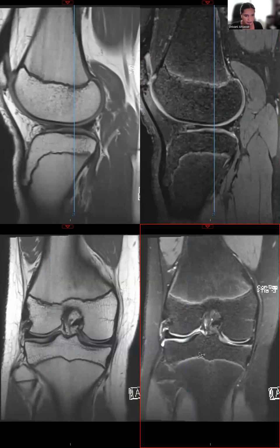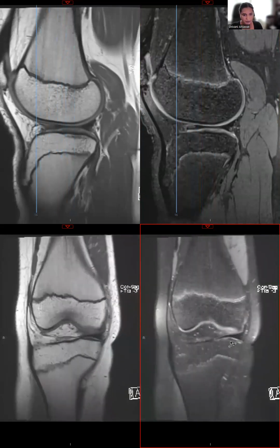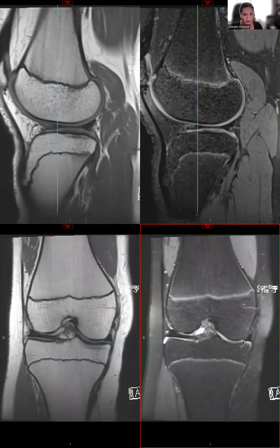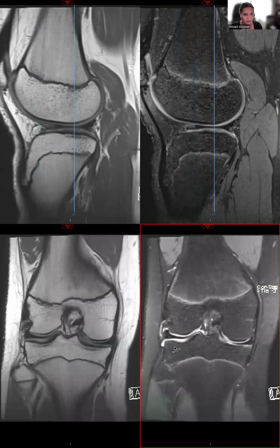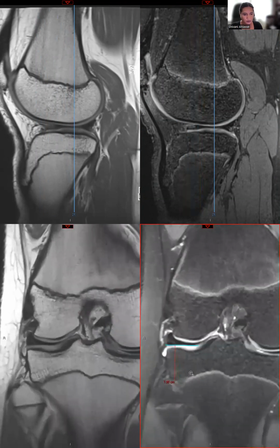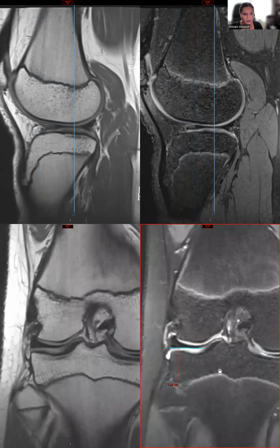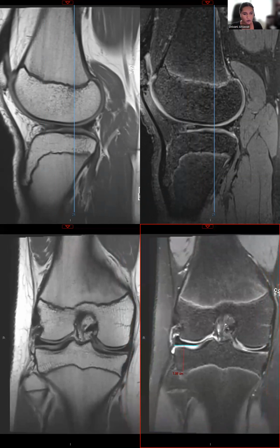The other thing I want you to notice in this person is the medial meniscus has a normal triangular shape that becomes kind of small in the body. In contradistinction, this lateral meniscus never quite becomes small in the body. If you measure it, it ends up measuring almost 2 centimeters. So that meets criteria for a discoid meniscus. In a mid-coronal section, if it measures more than 14 millimeters, that meets criteria for a discoid meniscus, and those people are prone to tears more often.